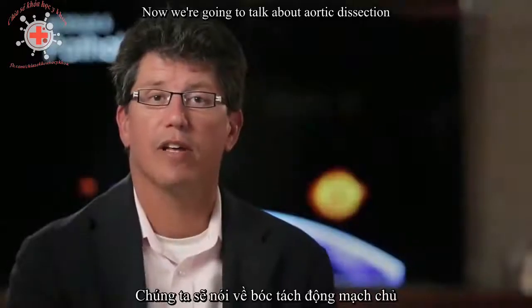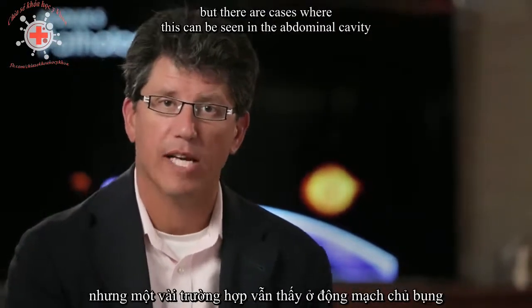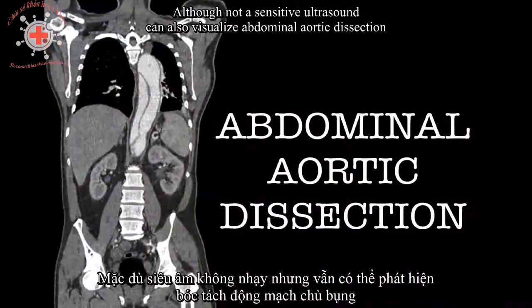Now we're going to talk about aortic dissection. Typically, this tends to be a thoracic pathology, but there are cases where this can be seen in the abdominal cavity. So we'll show you some cases of that as well. Although not as sensitive, ultrasound can also visualize abdominal aortic dissection.